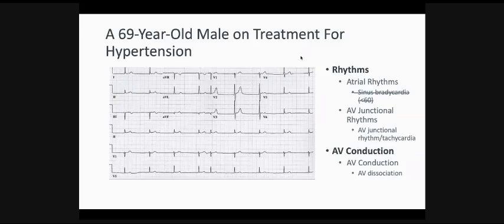And this is like a killing mistake in the ECG. If you code an AV junctional rhythm, then you cannot code a sinus rhythm. These are two distinct and different features. And if you code both, then the system will delete both answers. So keep this in mind. If you code an AV junctional rhythm, whether it's a junctional tachycardia or junctional bradycardia, then you cannot code a sinus bradycardia. And similarly, if you code a complete heart block, you cannot code a sinus rhythm as well.